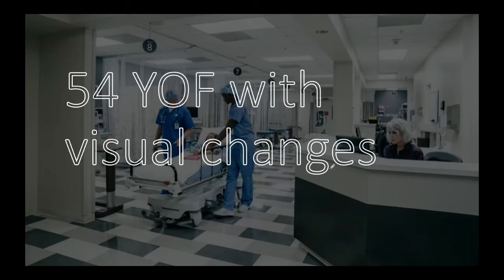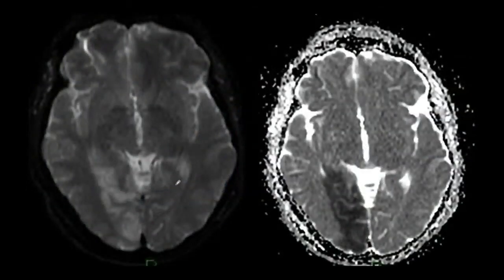54-year-old female with visual changes. Which distribution is this one?